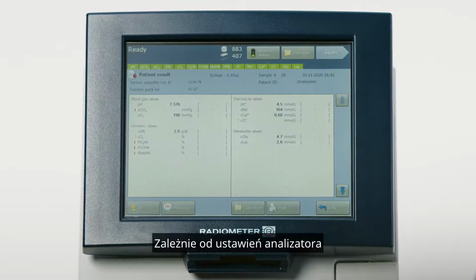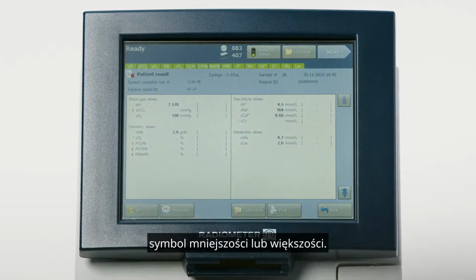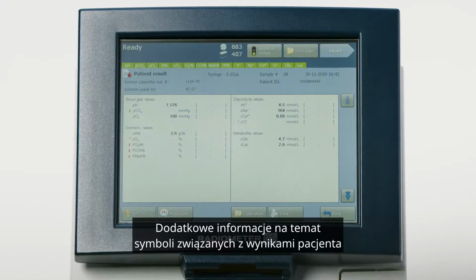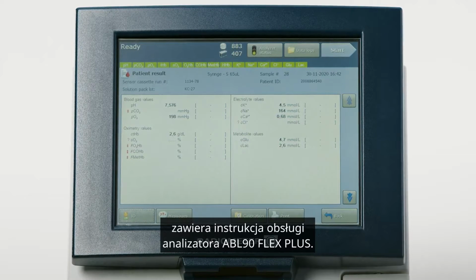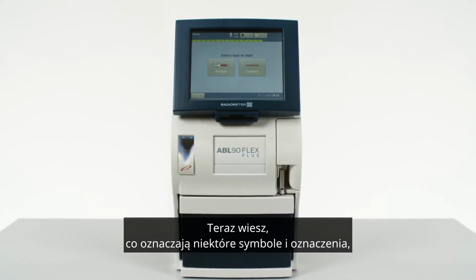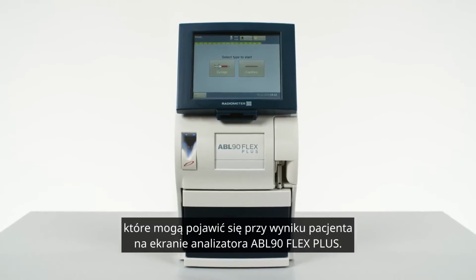Depending on your analyzer settings, you may see a greater than or less than symbol next to the set reportable range. For additional information on symbols related to patient results, please see the ABL90 FLEX PLUS instructions for use. You have now learned how to interpret some of the symbols and notations that may appear in a patient result on the ABL90 FLEX PLUS analyzer.